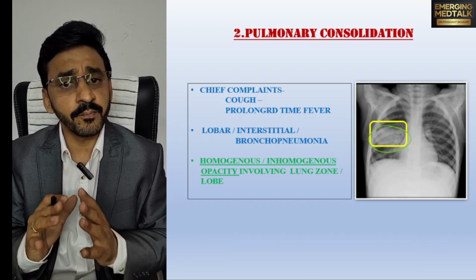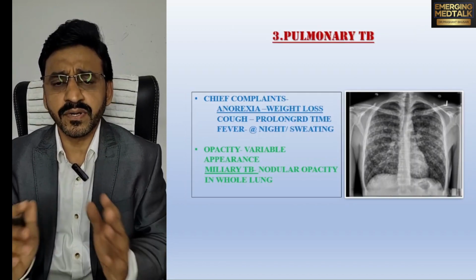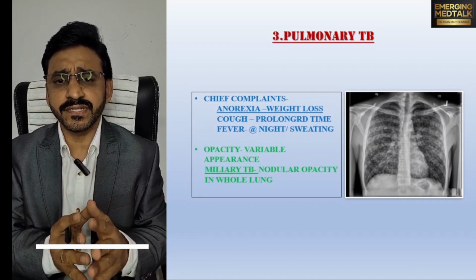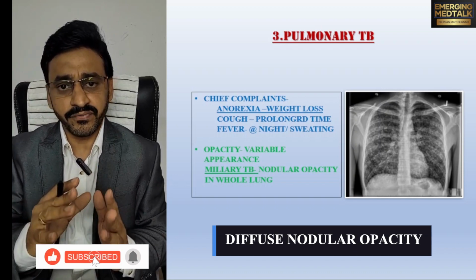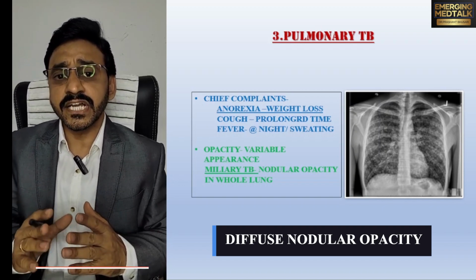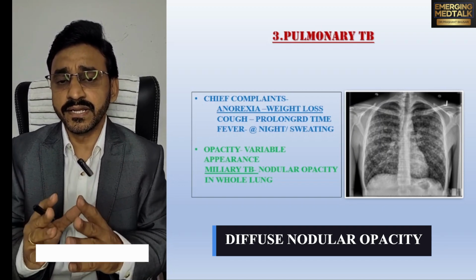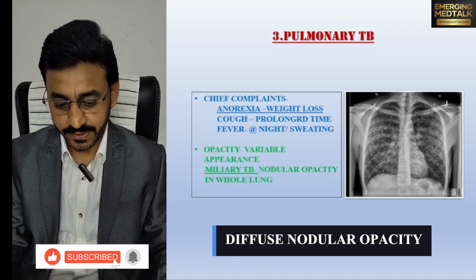having various patterns. So here is pulmonary tuberculosis, in particular very common in India, in the right upper lung zone, but when the spread is hematogenous, then the condition is called miliary tuberculosis, where the appearance is diffuse and nodular.